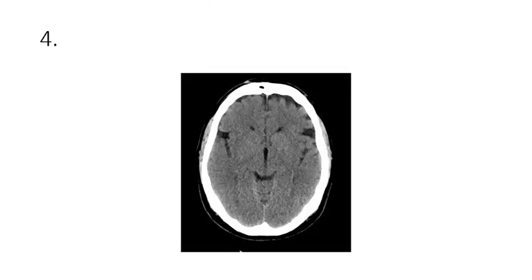All right, let's move on to this. Okay, what are you seeing here? You see there are no normal sulci and gyri.